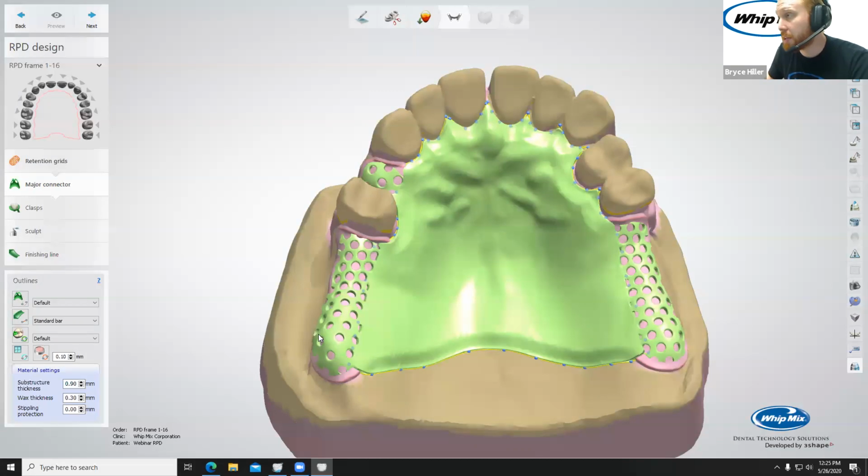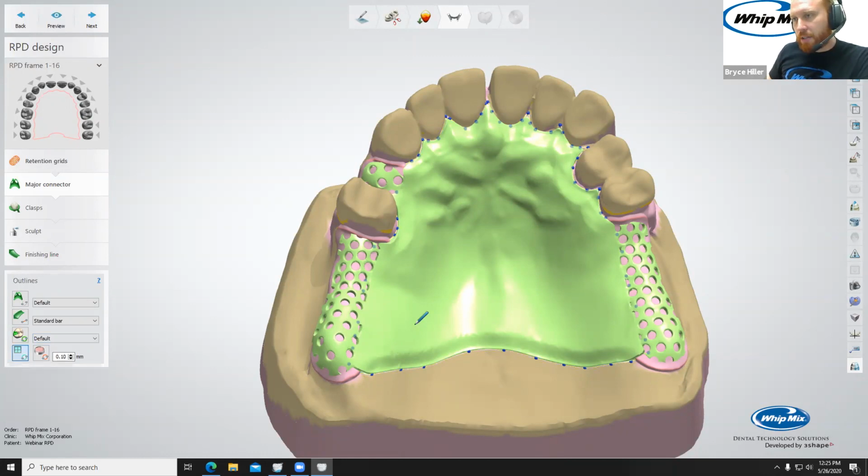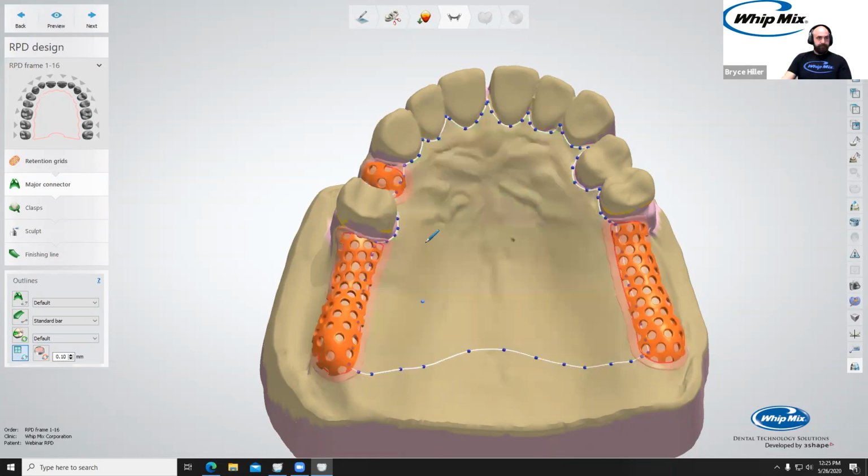It's probably more work than is necessary, but that's something really nice about this module: you have a lot of different options. If there's something kind of weird that you need to do, chances are you're going to have the right tools to do it because it's a very open module.